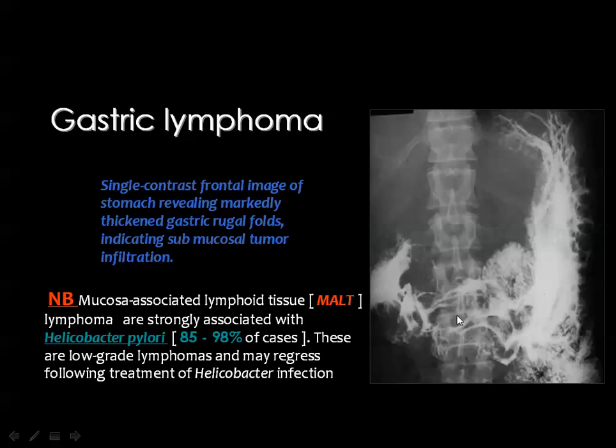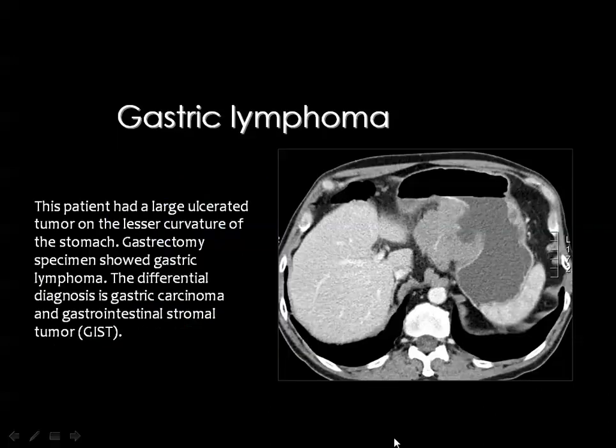of the mucosal folds. You remember when I mentioned hypertrophic gastritis, the issue of chronic gastritis, I mentioned that one of the differential diagnoses of cases presenting with hypertrophied gastric mucosal folds is lymphoma, together with hypertrophic gastritis.